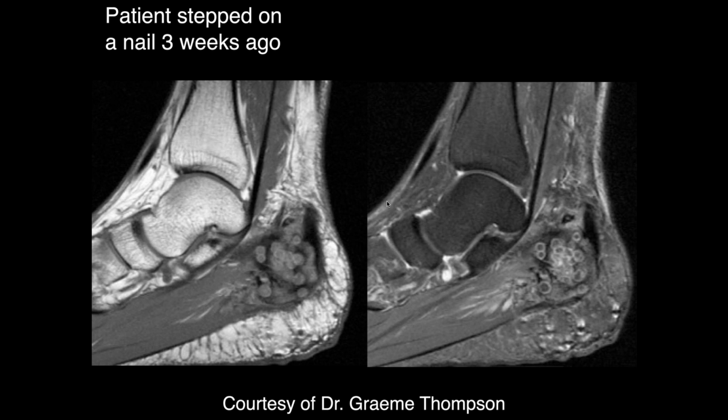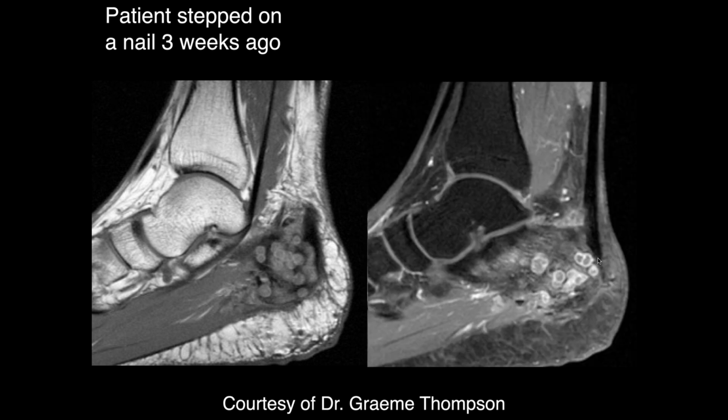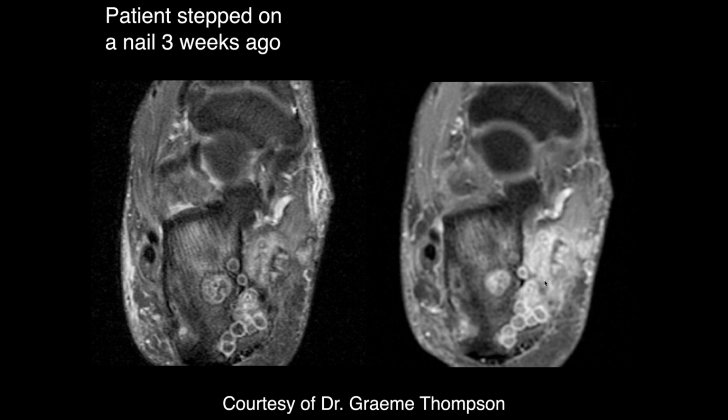Okay, so I don't know if it's in the soft tissue, it actually looks centered within the aspect of the calcaneus. There are all these hyperintense rims with central hypointensity nodularities within the bone. This is like a fungal type infection. Yeah, it's a little bit off to the side. There's the lip of the calcaneus. This is the only way you can tell it's a calcaneus.